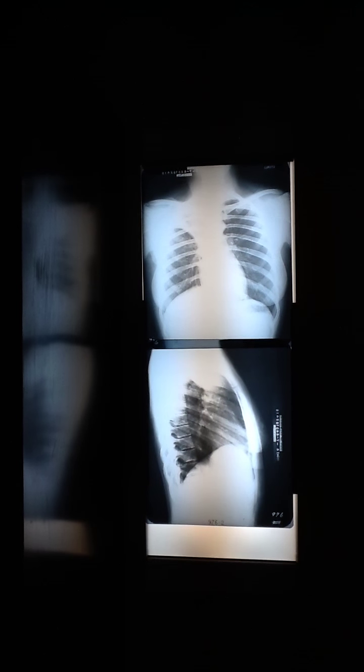How did the density change on this one? Because this doesn't look like this, does it? So how did the density change? Got denser. Okay, so the lung moved to water. And what's the distribution? Because the first thing is, how did the density change? Second is distribution. Unilateral. Mine is local. This is unilateral localized, isn't it?